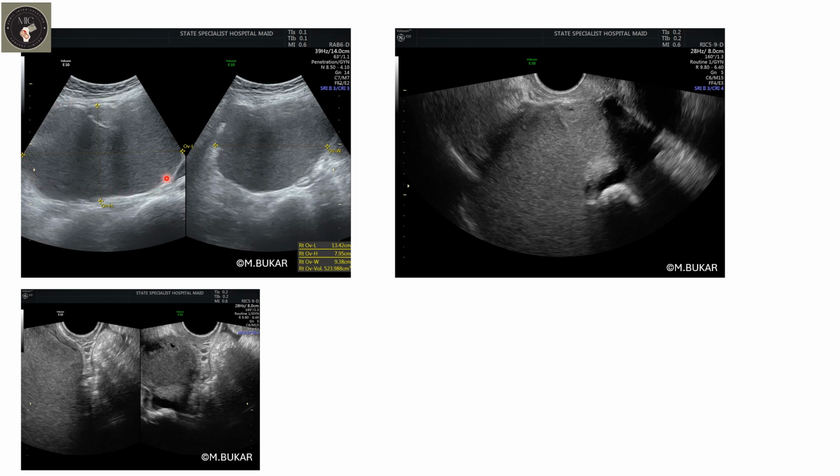Look at this lesion, which one would describe as ground glass appearance. I remember ground glass appearance is seen in about 50% of endometriomas and is one of the benign simple descriptions which, if seen in premenopausal women, is suggestive of endometrioma. But remember, this was in a 55-year-old, so she is postmenopausal.